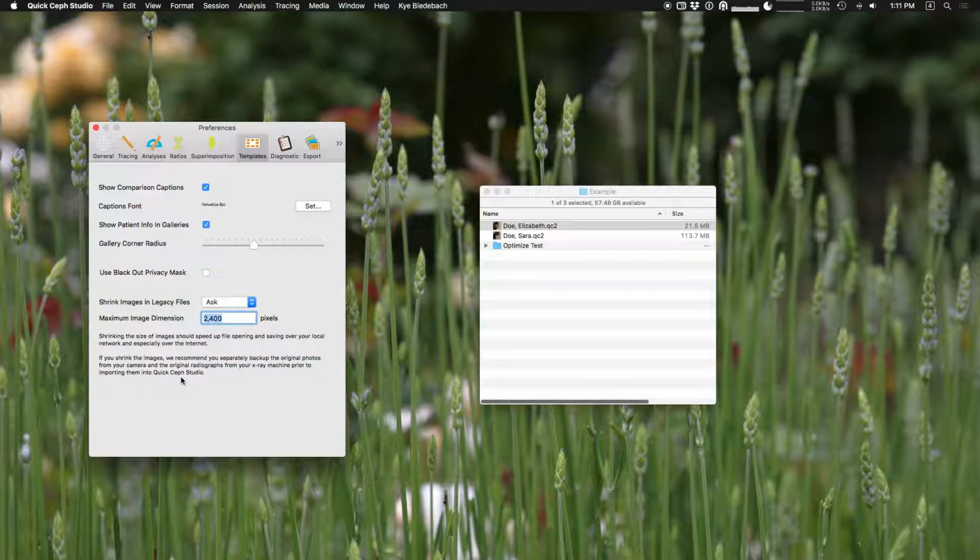Generally the biggest thing you're ever going to do with these photos is print out a full-size sheet of paper or present them on a presentation. A presentation is never bigger than HD resolution, and a piece of paper is a lot smaller than the size that most photos get saved to. So this is to combat buying a 20 megapixel camera and people just taking those images and not resizing them down to the proper size.